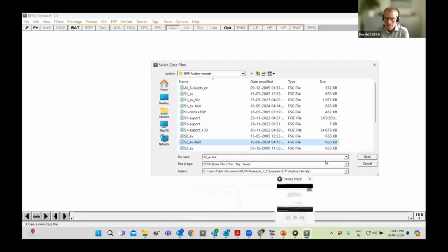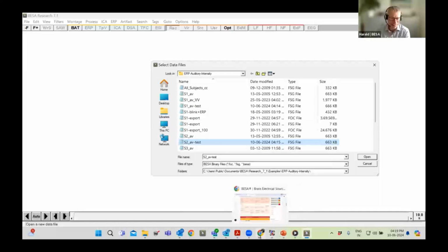Yeah, I think this depends on what you want to analyze. For example, I think we did a webinar on resting state connectivity. That's on the YouTube channel. For this particular example, we created triggers at fixed spacings.